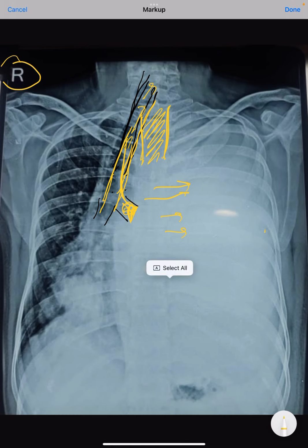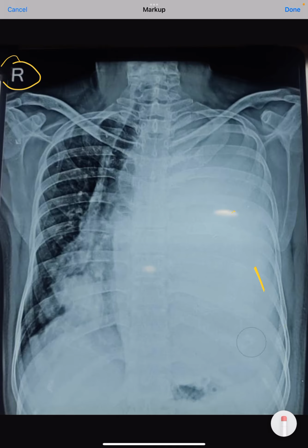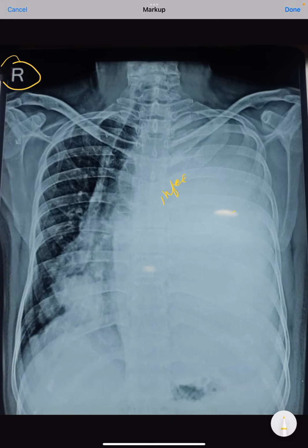So if it is pushing, it has to be something very rigid, which is pleural effusion or a mass. A mass usually can be at one particular place, so it cannot usually completely occupy the whole space from left to right, and it should not actually block the costophrenic angle. So most probably someone can have a mass with gross pleural effusion, or the patient can simply have gross pleural effusion because of infective pathology.